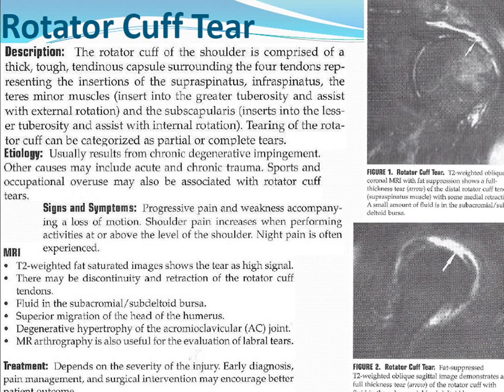If it's fully torn and it's been retracted long enough that the muscle becomes atrophied, then there's no point in really doing any surgical treatment at that point. So MRI is going to be really important, not only to look at the tendon in that case, but to look for signs of edema in the muscle. Edema in the muscle means acute atrophy is going on, and edema is a bright T2 weighted signal. Eventually when it becomes atrophic, it'll be fatty signal on T1 weighted imaging, and that'll tell you it's a bit too late to repair the rotator cuff tear. You can always strengthen the surrounding muscles and try to support the rotator cuff with them, but you wouldn't repair in that case.